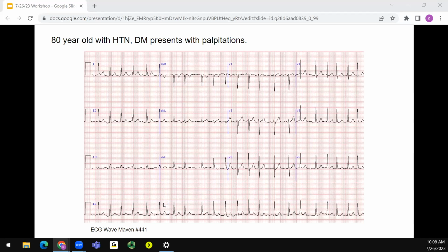There you're going to see usually more than three different kinds of P waves in the same lead, in the rhythm strip, and that's going to give you the clue. And again, always correlate things clinically. Usually MAT you're going to see in patients with bad COPD, and that's when you're going to suspect it and look for it.